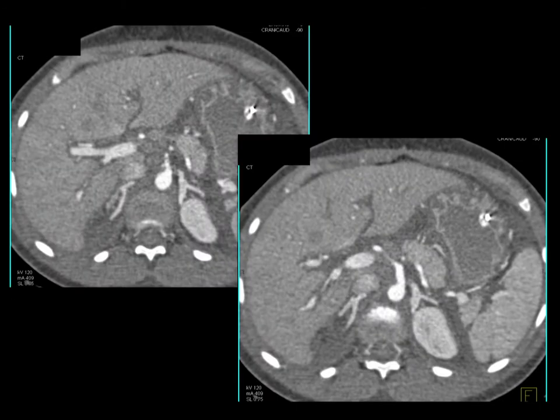And typically it was described in pediatrics and then trauma, or pediatric trauma. Pneumothorax, consolidation, blood in the abdomen. Look how bright the adrenals are. You notice they maintain their adrenal shape. They've not bled into the adrenals. There's no mass effect. They're just very, very bright.